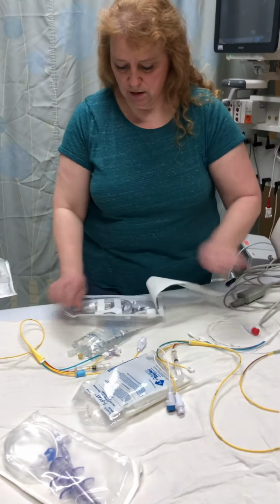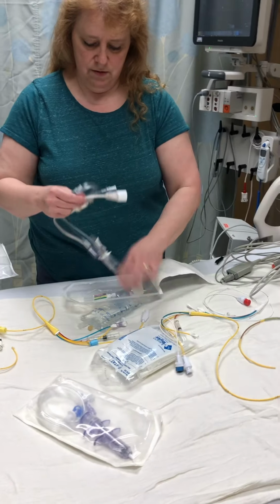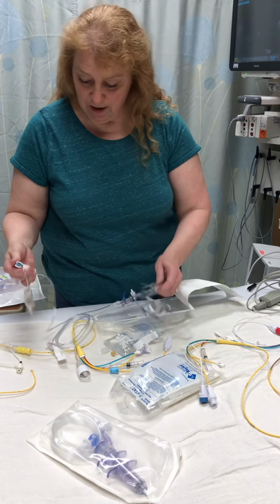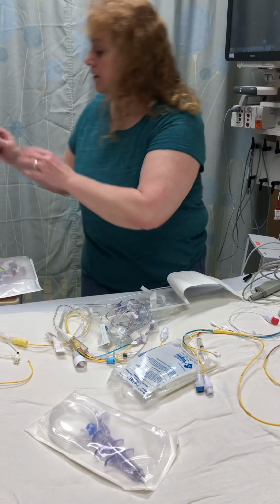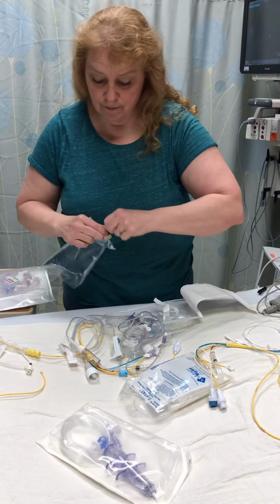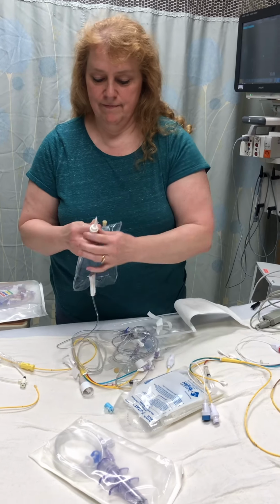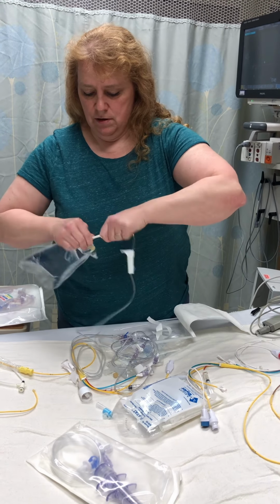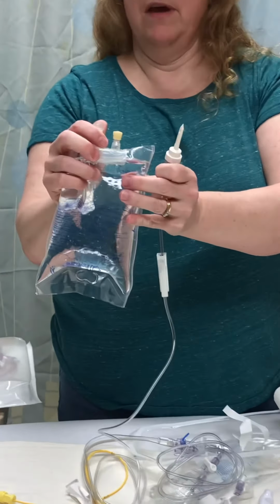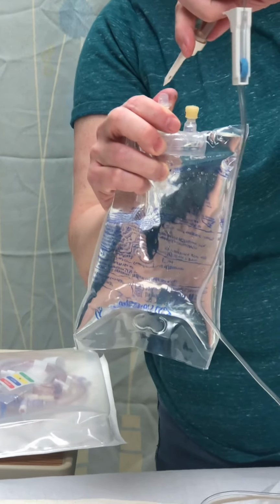with the pressure bag. So you're going to set up the pressure tubing like you normally would, and nice basic review for anyone. Set it up just like an art line. You're going to poke it. You're going to burp the bag, get rid of all the extra air, because when you get to the end of the bag, you don't want all that air to get to the patient.